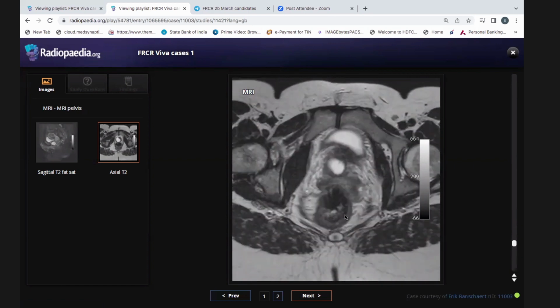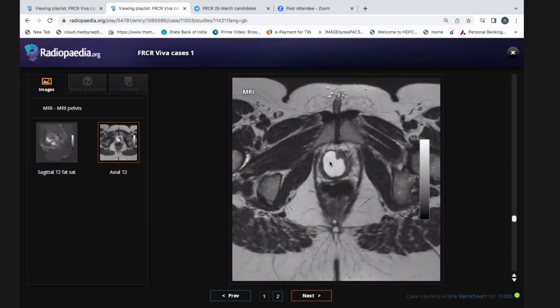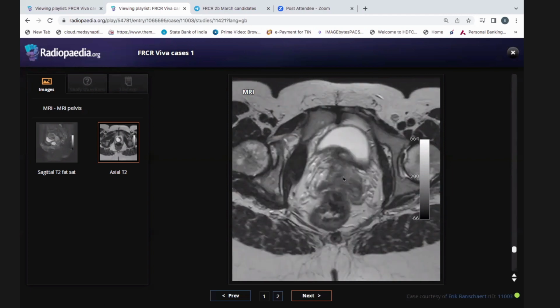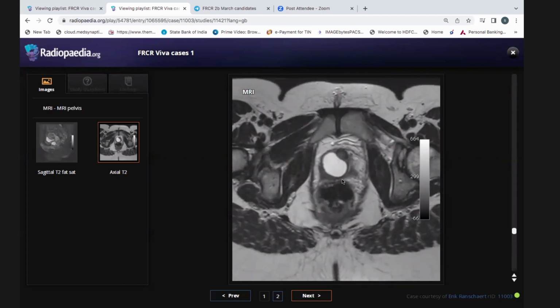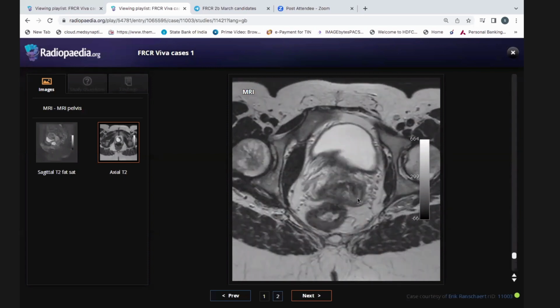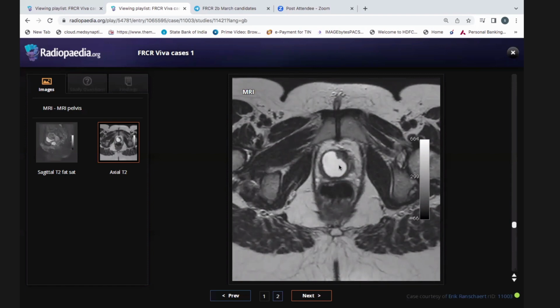So I would like to check contrast enhancement. There is soft tissue thickening and irregularity also seen within this area. So I'm worried in this presentation about prostatitis. I'm checking contrast enhancement as well for this soft tissue thickening. Is it an enhancing component to be worried of any malignancy or not? And urgently informing a clinician if there is suspicion for urgent management.